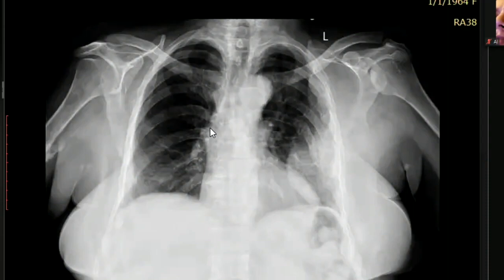Okay, fine. So I would just give some tips: in the exam, whenever you look at the X-ray, the description of the primary area was fairly good. But whenever you look at anything like this, always look at the surrounding bones very carefully by coming a little closer to the film. I think this break should be visible on your X-rays.